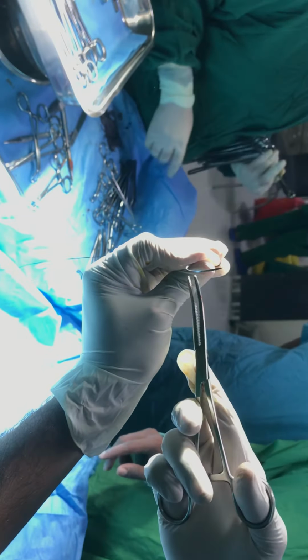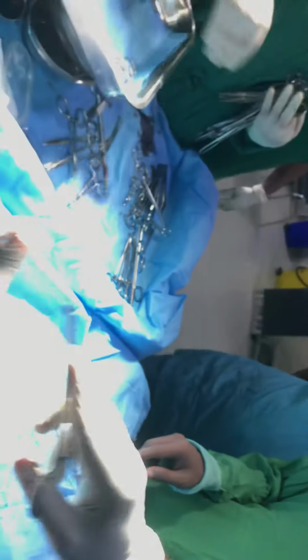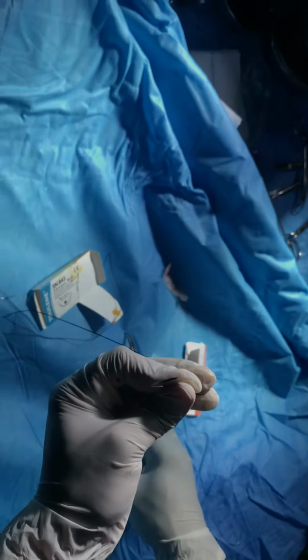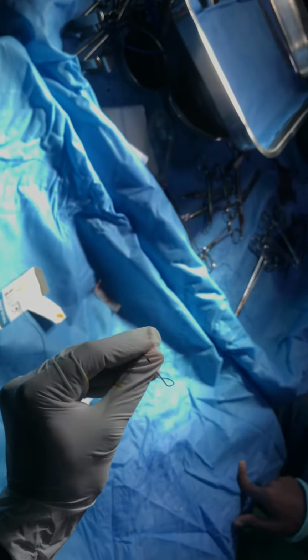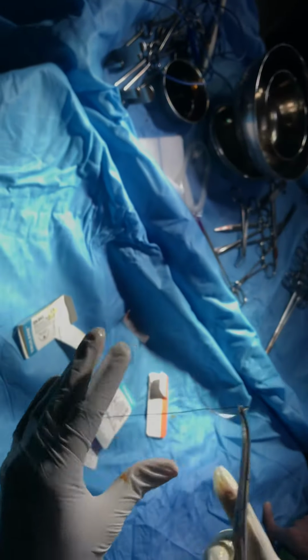But in some needles you will have the apex facing downwards. If you take the cut section, you will have an appearance like this. That is apex facing downwards. This is known as the reverse cutting needle. If the apex is facing upwards, that is a cutting needle, but when the apex is facing downwards, you have a reverse cutting needle. Reverse cutting and cutting needles are basically used to take suture material through very tough structures like palm, sole, rectus, all these things.